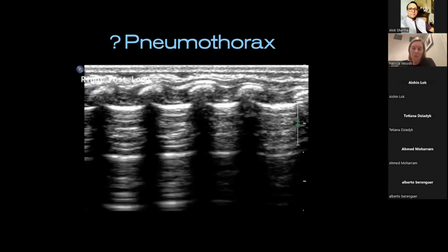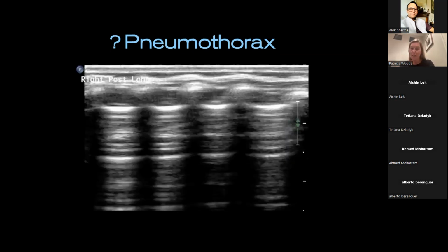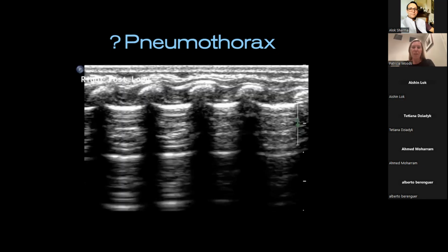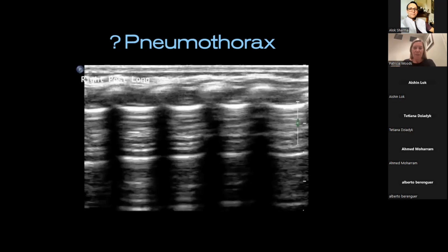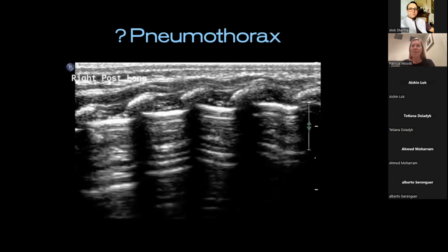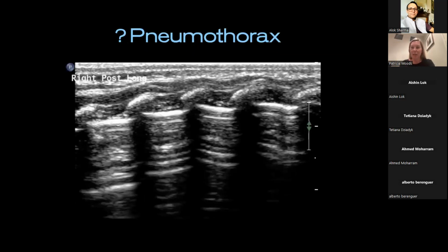No, it's a strong suspicion. You need lung point really here. Okay, so it's very suspicious. And actually just looking at one tiny region, if what, so what? Okay, it's not always really that important. It might just be a sliver, a couple of millimeters next to the paravertebral space.